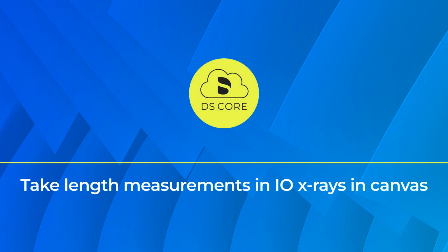In this tutorial, you learn how to use the IO length measurement tool to assess intraoral X-ray images with precision and support your endodontic treatment planning. This feature gives you the ability to measure anatomical structures directly in 2D IO X-rays, helping you evaluate case difficulty and estimate endodontic file selection.